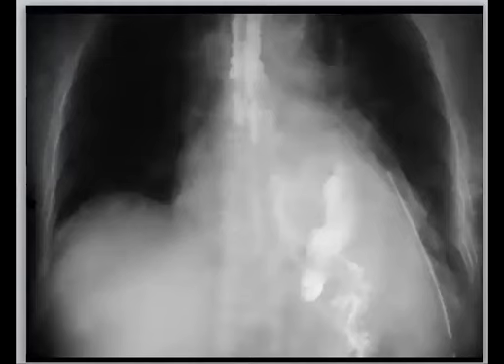Let's go to this case. So when you find there is a contrast, this contrast extravasated but extraluminal, and as you see the contrast from the esophagus, then the esophagus ruptured. So one of the best differentials, as Marwa told us, is Boerhaave. Leakage can also be if this patient underwent a recent operation.